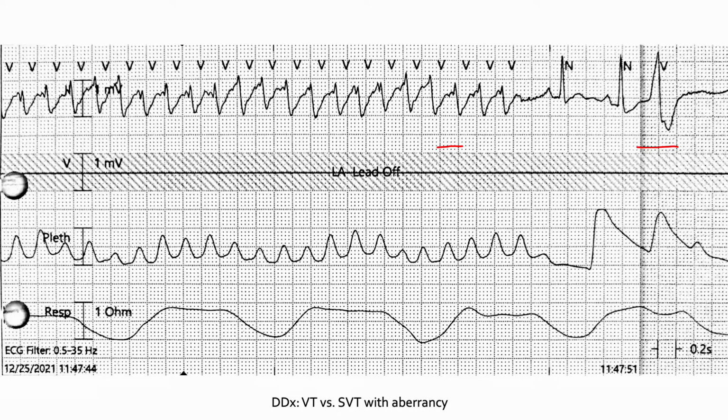Looking at this rhythm strip, I see that there's initial fast forces in the QRS, and there's terminal slow forces in each QRS. And there's also this high frequency signal just before the initiation of the QRS, and I see it in every single cycle. So this is a good candidate P wave. I'm not 100% certain that it is a P wave, but it certainly looks like it's the P wave because it's high frequency and it's outside of the bounds of the QRS.